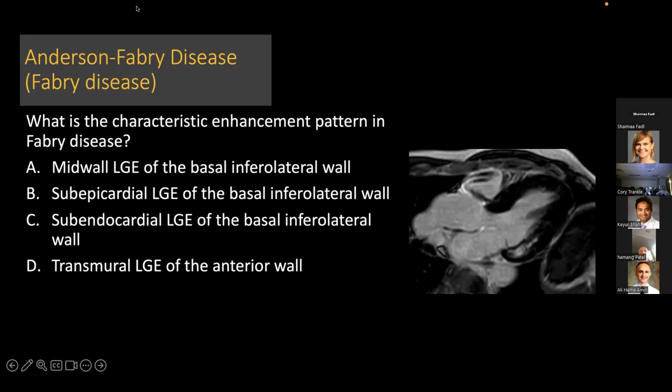The image is of a patient with Fabry disease. And most of you got the answer correct: mid-wall LGE of the basal inferolateral wall. Excellent.